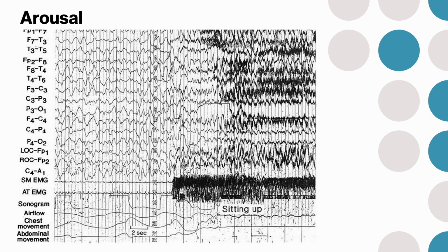Here's an old study with a confusional arousal out of slow wave sleep. You see the big delta waves, and then all of a sudden all this dark stuff happens. This is a little unusual because there are still big waves here, and it's an arousal, but almost an awakening, which is an arousal that culminates into an epoch of wake. But the patient is still sleeping while sitting up here.